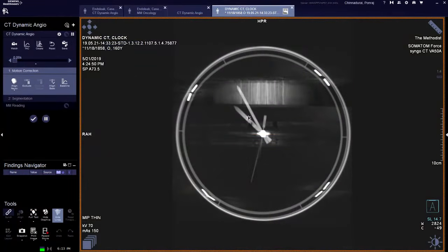So this is the scan that we took, and just to orient, you're going to see the same interface for our clinical cases as well. So you see the short and long hands and the second clock. You scanned the clock. Okay, now I get you.